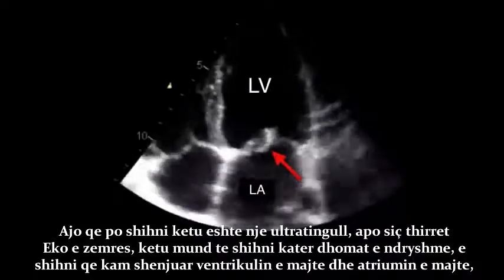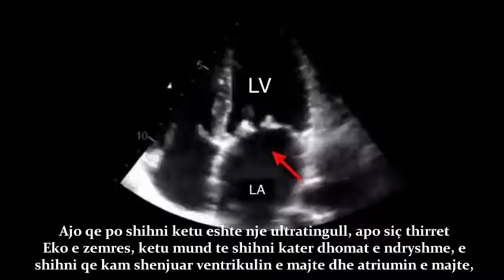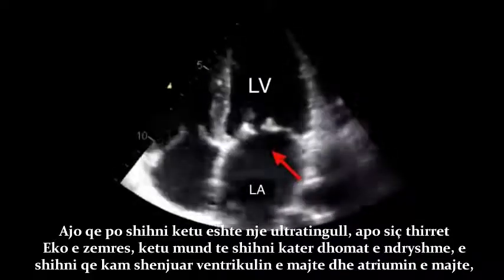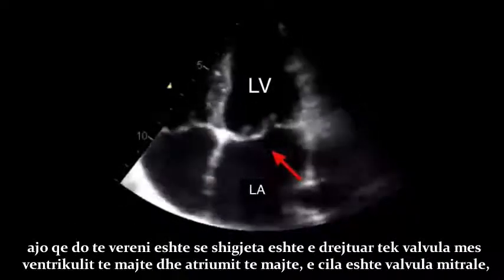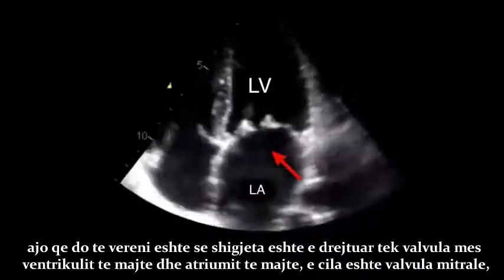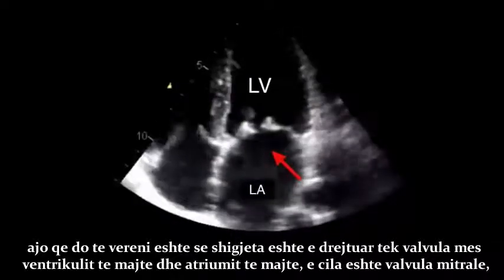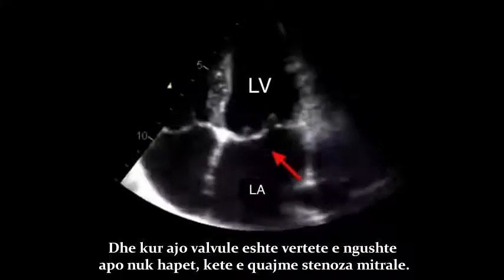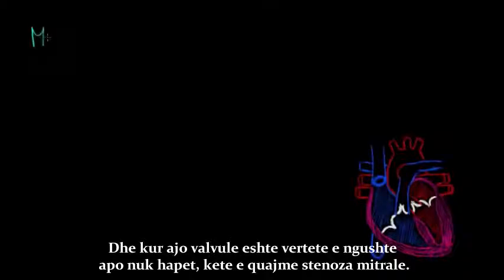So what you're looking at here is an ultrasound, or what they call an echo, of the heart. And you can see the 4 different chambers, and you'll see I've labeled the left ventricle and the left atrium. And what you'll notice is that the arrow is pointing to the valve in between the left ventricle and left atrium, which is the mitral valve. And that valve is actually not opening. And so when that valve is really tight or doesn't open, that is what's called mitral stenosis.